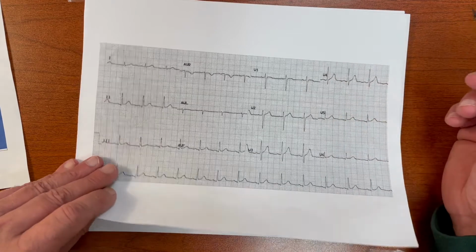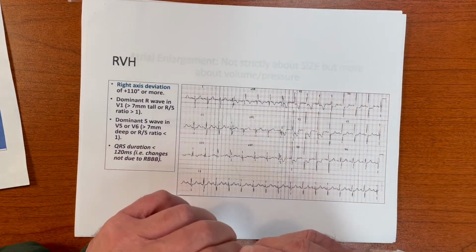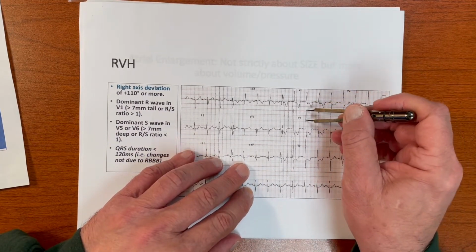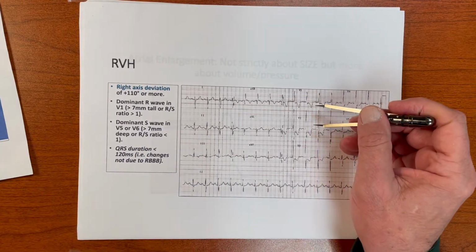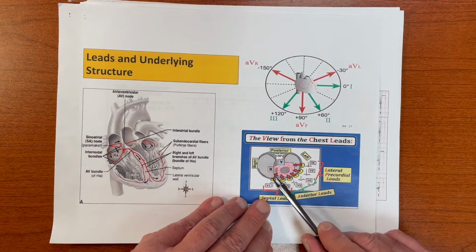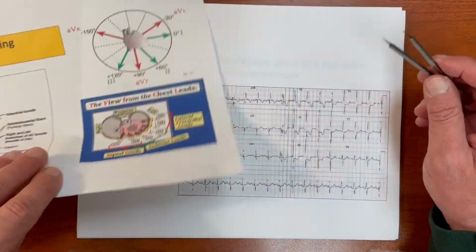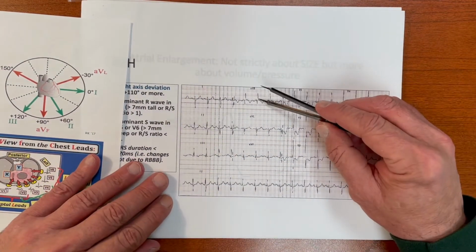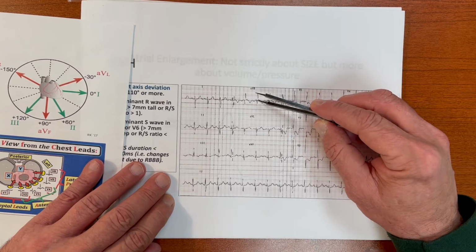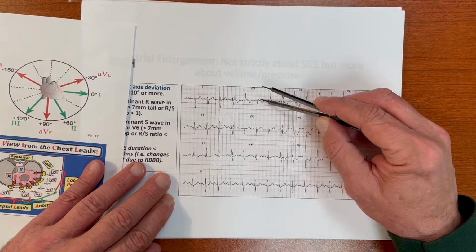This is a normal EKG. And now here we look at V1 and V2. This is nothing but a big R wave in V1 and a big one in V2, okay? That's because you're going right at V1. You have a lot of muscle mass there. Also notice on this EKG, look what aVR looks like. It looks almost biphasic, doesn't it? That is, there's a negative initial component, so it's not all up, it's not all down like it should be.